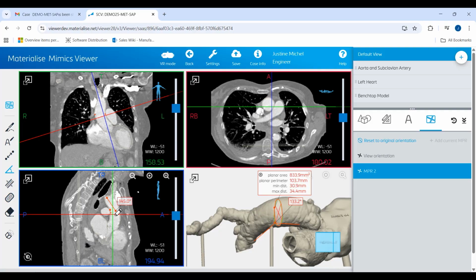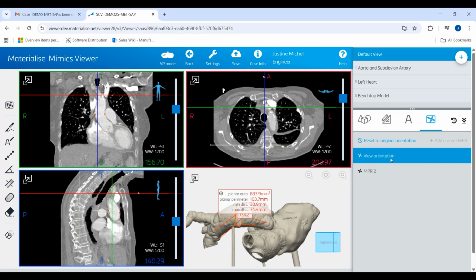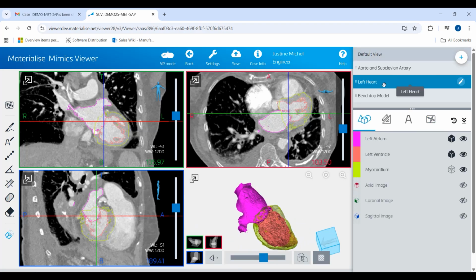Above the measurement tools are 2 annotation tools. These will only be visualized when you have editing permissions to the case. The first tool allows you to provide text annotations. The second tool allows you to provide basic sketches to clarify the annotation.